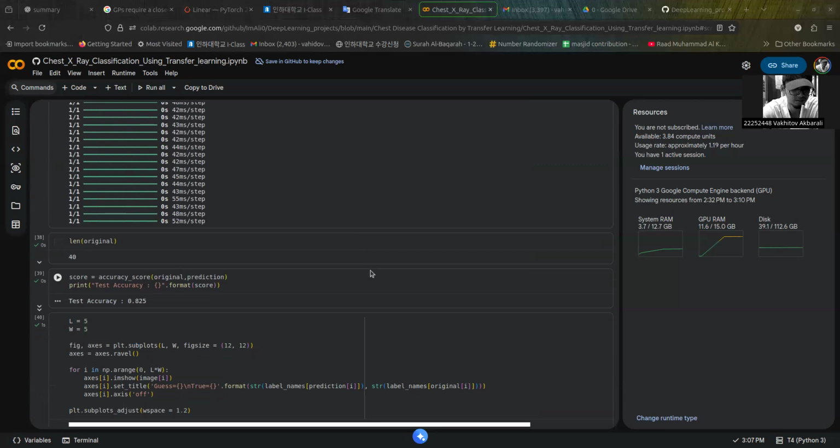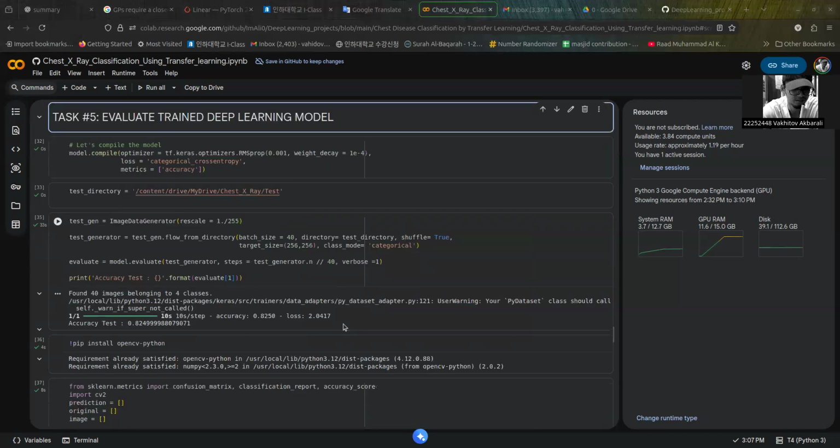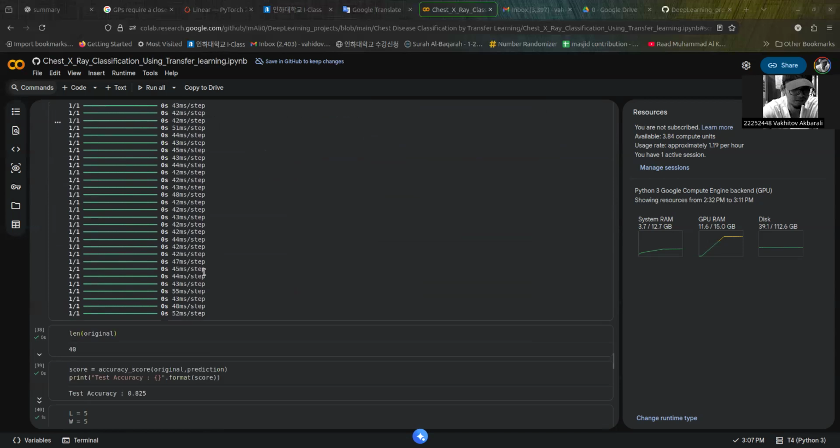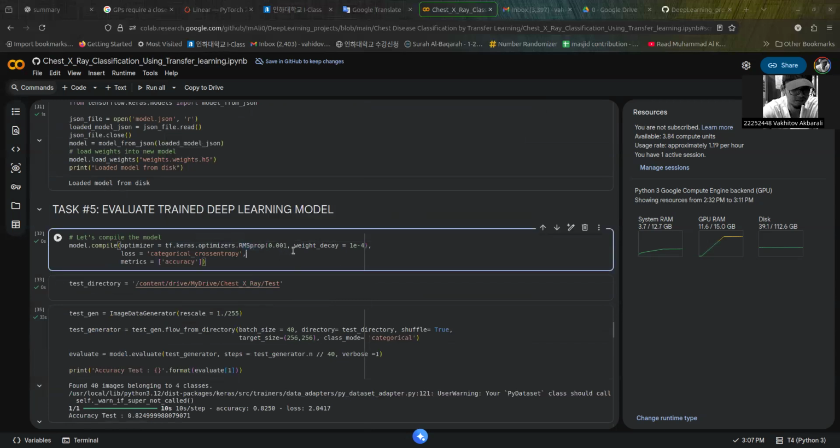So yeah, this is it for the presentation demonstration. Here's something else I forgot to mention: I used RMSprop for the optimizer because I found it to be the most effective for this specific task rather than Adam, adaptive momentum. I just can't exactly locate the code cell. It should be somewhere. Here it is, RMSprop. So this is the optimizer that I used for this project.